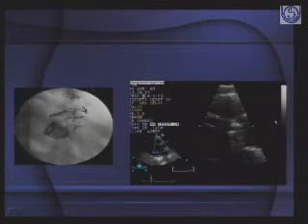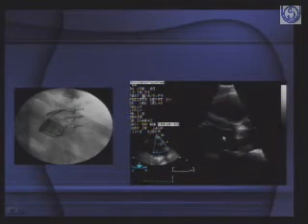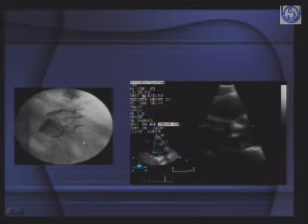So here he is showing you two valves on fluoroscopy, and you can see the aortic valve in position so clearly here. I think these were two valves, no? This was a Starr Edwards valve and a bileaflet, yeah.